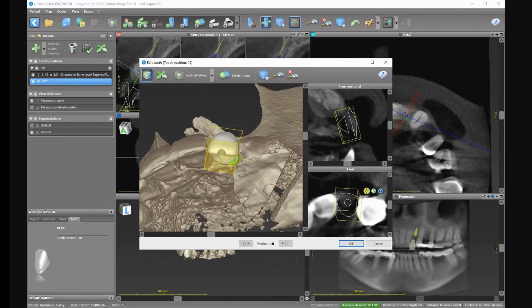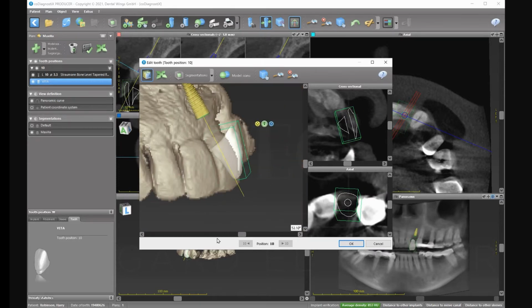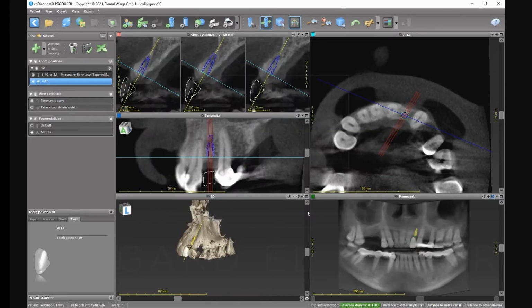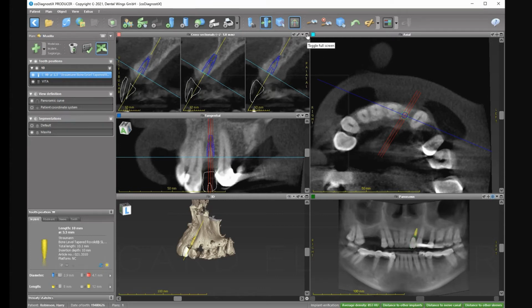Again, it should not take that much, so now here I'm going to widen it a little bit. Okay, and I turn it back up. I look at it from the sides, it's pretty good. Yeah, and now I can make it a little bit taller. Yep, there you go. So we are in good shape here. So I can move the implant back to here. I can even turn it a little bit, and I'm still coming from the cingulum. Now this we can verify even further when we do the Synergy.